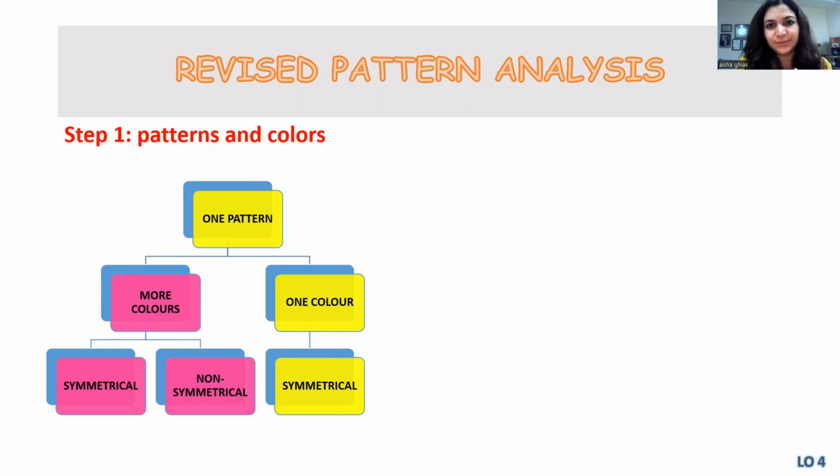Okay, let's revise them. The 5 basic structures were line, pseudopod, circle, dot, and clod. If any of such structures is repeated over more than 20% of the area, it constitutes a pattern. And if it's less than 20% area, it constitutes a clue.